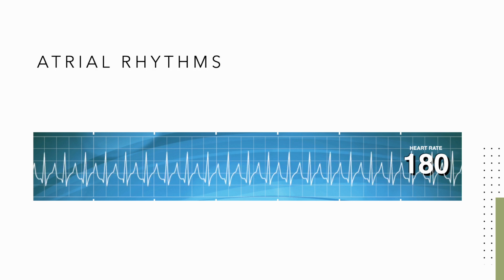Now we are going to move into the atrial arrhythmias. The first atrial arrhythmia I will talk about is something called supraventricular tachycardia.